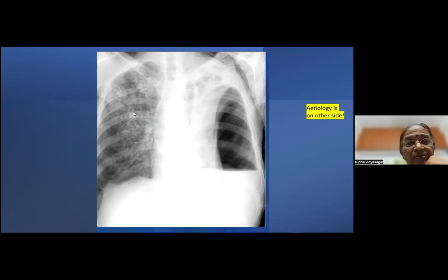And this side, what happened? What happened to the other side? What does that look like to you? What disease does it look like to you? Okay, non-homogeneous opacity occupying the right upper and middle zones. Okay, looks like ILD. It's a predilection to the upper lobe, isn't it? So that's why you should probably think of a tuberculosis.